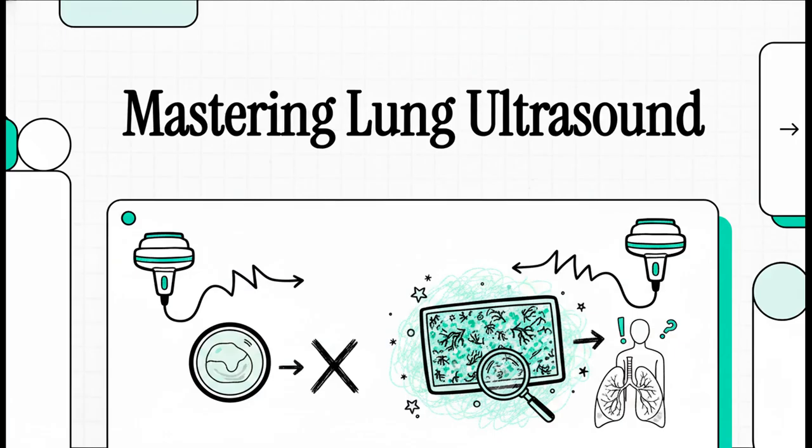Usually when we think about medical ultrasound, the goal is getting a crystal clear picture of the anatomy, right? We actively try to filter out all that visual static. But when it comes to lung ultrasound, that static, those visual reverberations and crazy artifacts we used to think were totally useless, they're actually our absolute most powerful, life-saving diagnostic tools. So today we're going to decode the static and master lung ultrasound together.